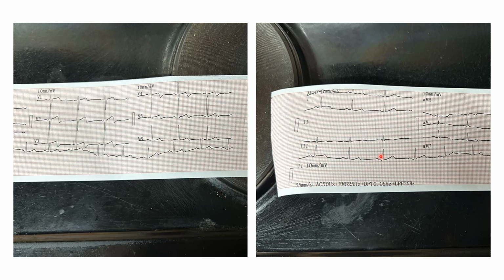So when we look at the ECG, remember, if any of this is confusing you, please go back, look at ECG Basics, the entire playlist that's there, and that will assist you quite a bit. So if you look at leads 2, 3, and AVF, which we have over here, we just have a slight ST elevation, but very slight ST elevation in lead 2 that we can see over there. You can see it sometimes on the rhythm strip as well, but because of the curved nature, which is something that you'll face as a doctor depending on the type of machine that you use, it's not something that you shouldn't be used to.